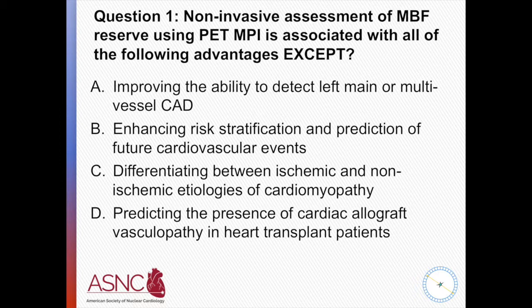Recent work has shown that there are certain findings expected or seen in this patient population, and with more findings, the likelihood that they have CAV, or cardiac allograft vasculopathy, increases. It speaks to the ability of PET MPI to assess microvascular function, which is one of the main findings in CAV.